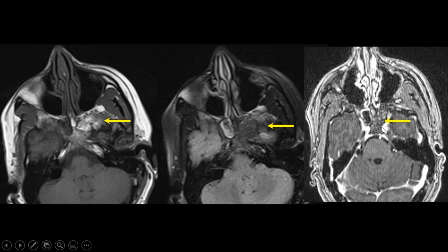And this just represents an area of arrested pneumatization or variation in the marrow pattern within the central skull base. And this is a benign finding for which no intervention is required. It's important to recognize this because it is quite common.